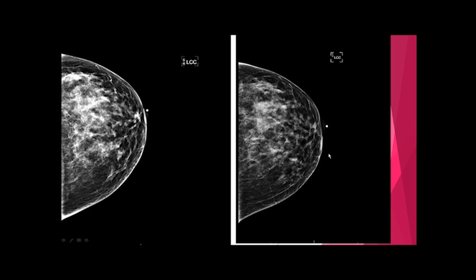Well, why couldn't she do that the first time? Well, maybe she was rushed. Maybe she wasn't paying attention as well to certain criteria to be able to have a good image. So there could be many reasons why it didn't happen. We don't know it at the time, but I'm glad the radiologist called this patient back to get a better image.